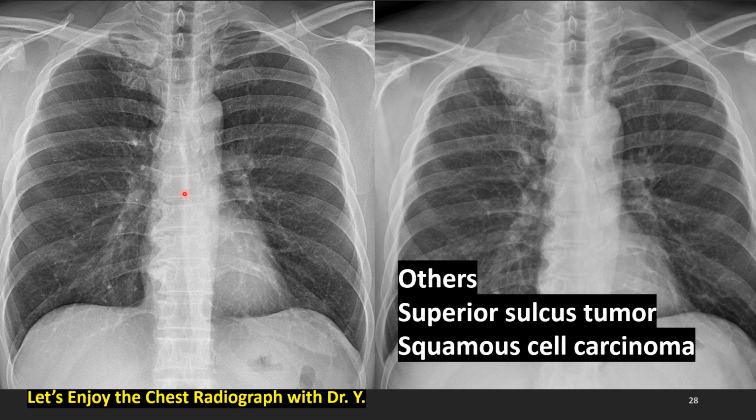What do you find in the left side film? This film is several months before the patient. Do you find what's wrong? I just told you the owl's eyes. Is the right owl's eye okay? What about the left owl's eye? Left side looks okay. Something increased here.